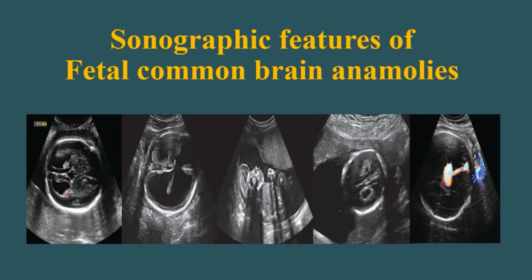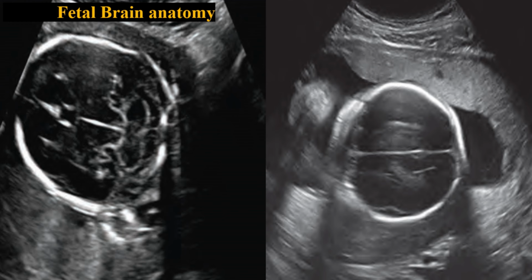Today we are going to discuss the sonographic features of common fetal brain anomalies. So first of all, we are going to discuss the fetal brain anatomy.